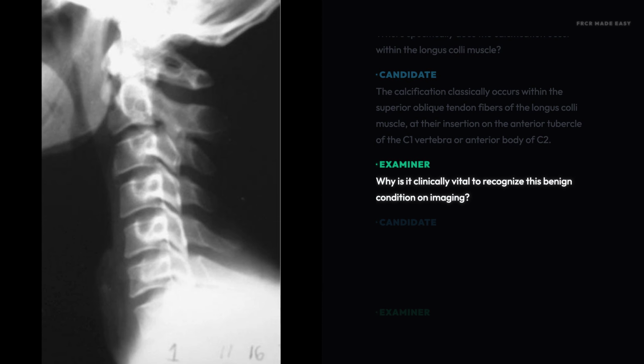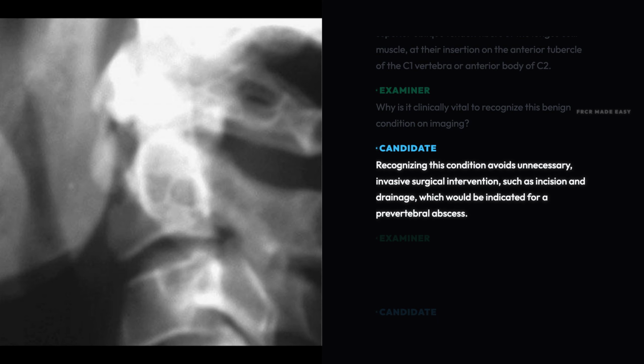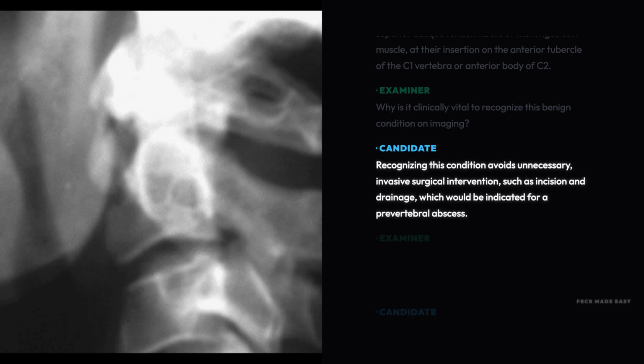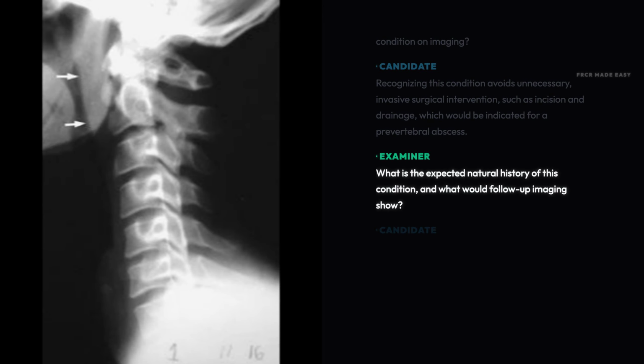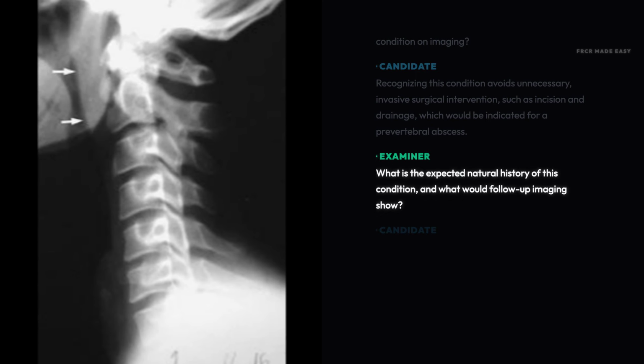Why is it clinically vital to recognize this benign condition on imaging? Recognizing this condition avoids unnecessary invasive surgical intervention, such as incision and drainage, which would be indicated for a prevertebral abscess. What is the expected natural history of this condition, and what would follow-up imaging show?